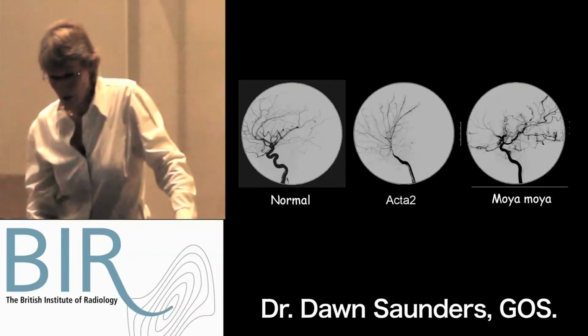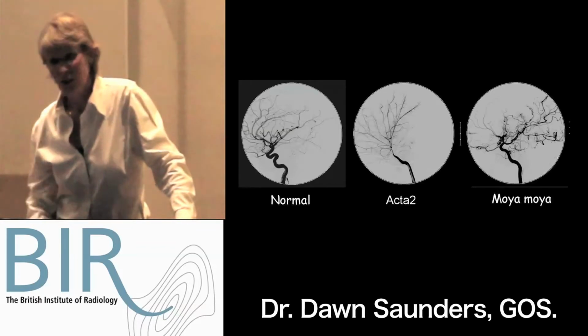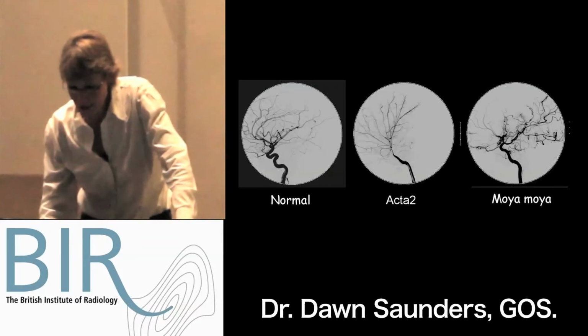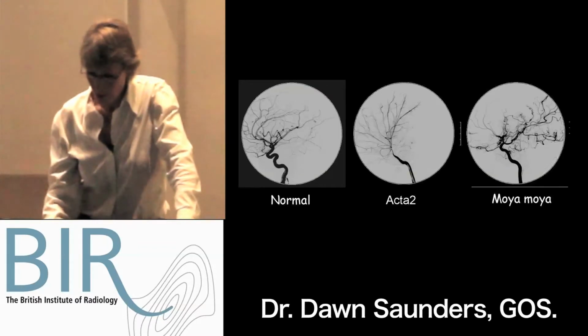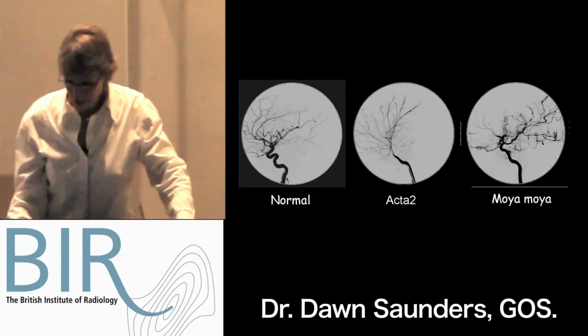Well, it's clearly not a Moyamoya pattern. You can see that there are quite obvious distinctions between the two, largely that there are no Moyamoya collaterals, and this very, very distinctive straight tapering of the internal carotid artery. Posterior circulation is involved in some children, but not as severely.